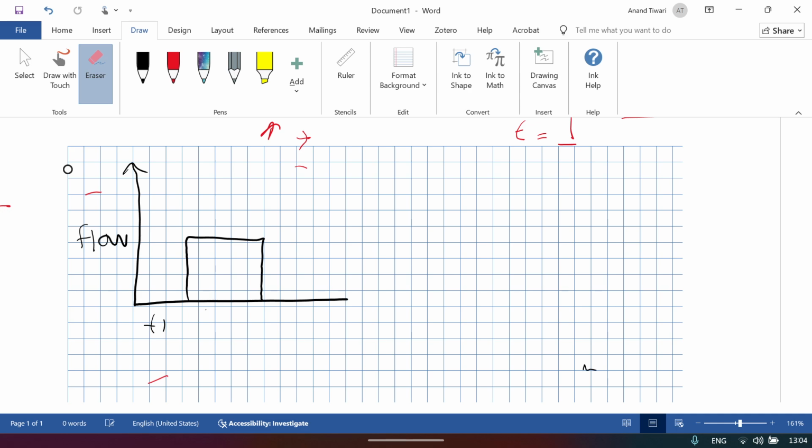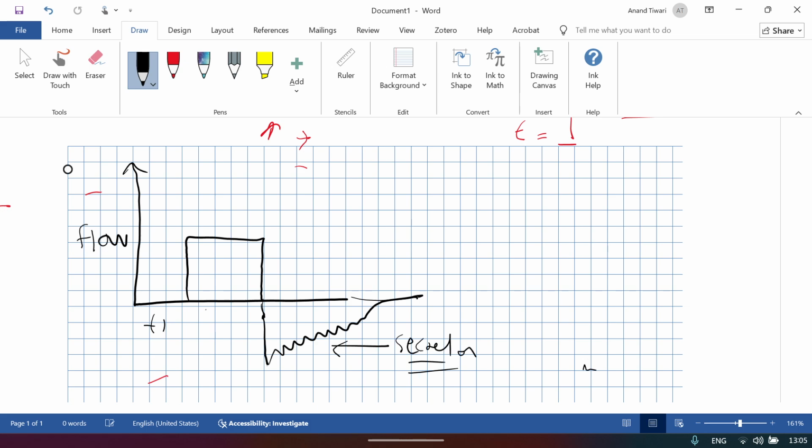Like in the expiratory limb, if you have the peak expiratory flow, and you see a lot of oscillations here, this kind of pattern will give you a clue that the patient has a lot of secretions, irregular oscillations. There is a time to do suction. So excessive secretions can produce this kind of picture in an expiratory limb.